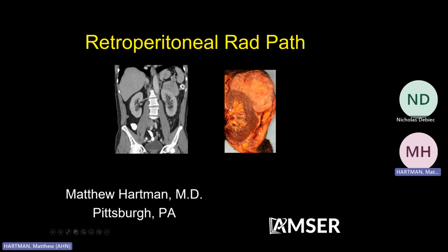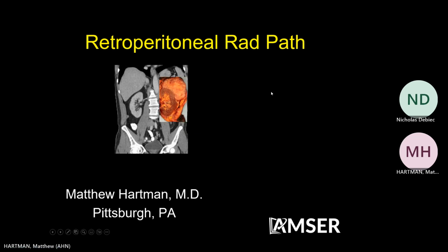We have a nice gross specimen here of a perirenal tumor. We'll see what this ends up being.